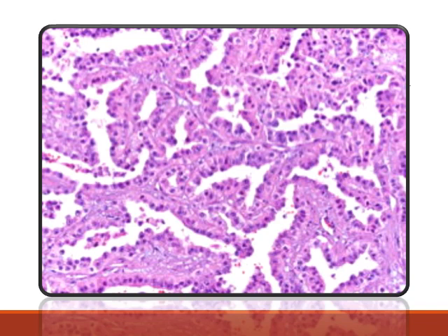I couldn't resist. It's histology. We're not pathologists, but what do you think this is? There are multiple projections, nipple-like projections with a fibrovascular core. I'll give you some clues. This is going to be a poorly enhancing lesion and it's going to be low signal on T2 weighted MR imaging because of this papillary pattern. This is a papillary RCC.